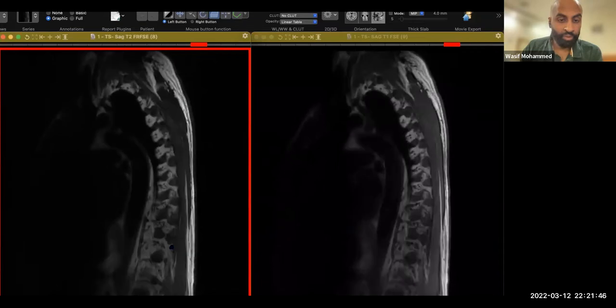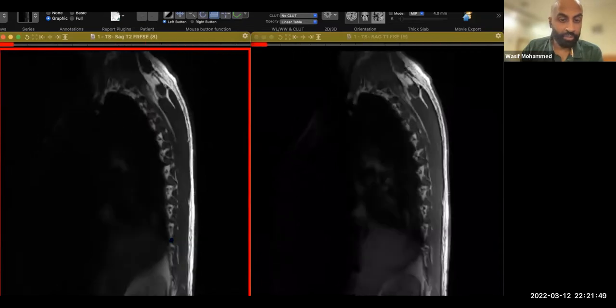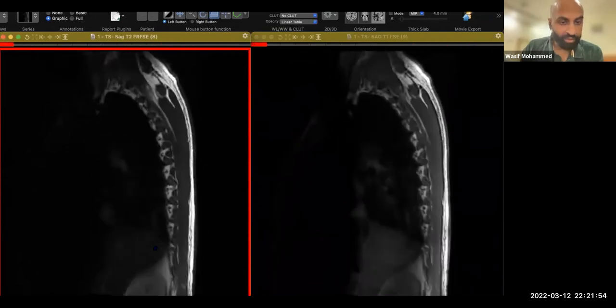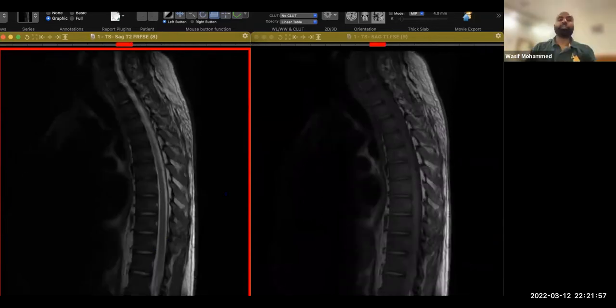Because there's no paravertebral masses which could suggest extramedullary hematopoiesis. There's no lymphadenopathy that I can see in the given sections. There's no enlarged spleen. So if the patient is an elderly male patient, then the examiner will himself tell you, no, this is like a 35-year-old or 40-year-old female patient. Then that would be less likely to be prostate metastasis. It could still be a diffuse form of multiple myeloma if the patient is elderly, but this proved to be CML. So I just wanted to hear you say differential for lymphoma.